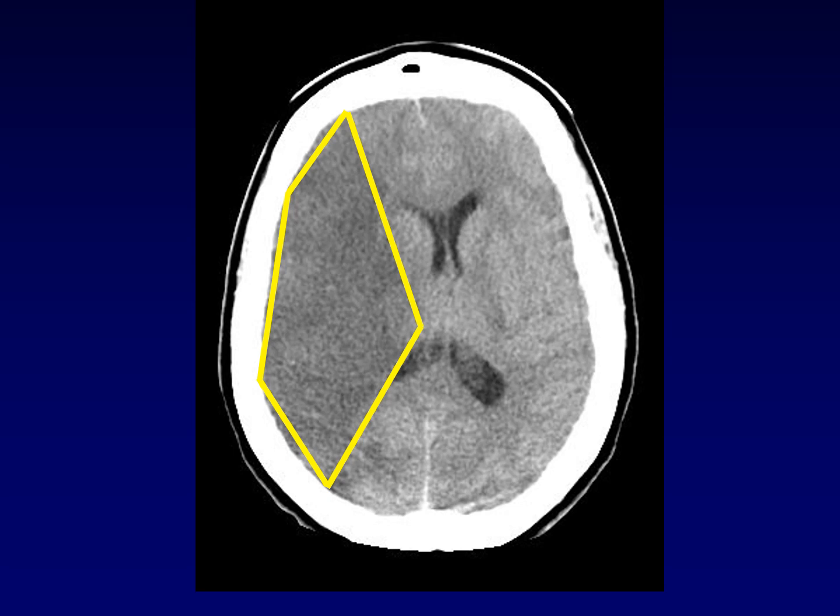So what happened here? This middle cerebral artery vascular territory is completely devoid of blood flow. This brain has died and become edematous because the vessels that normally feed the brain can no longer contain the blood completely. And there is a flow into this area, and we call this cerebral edema.